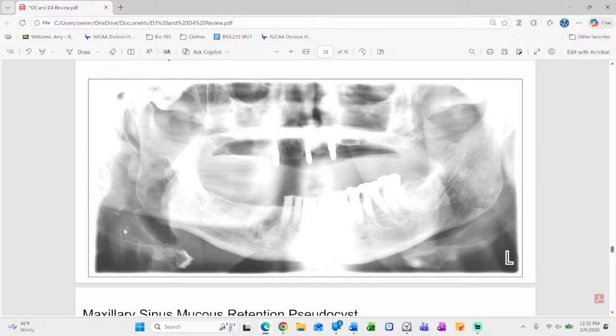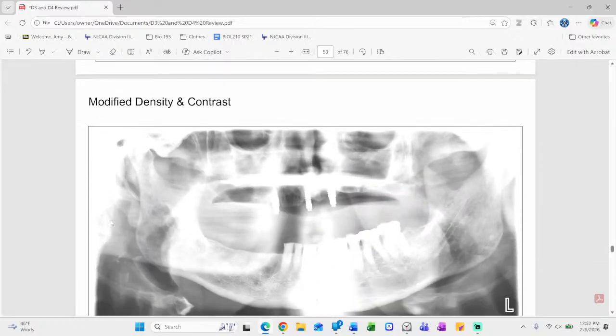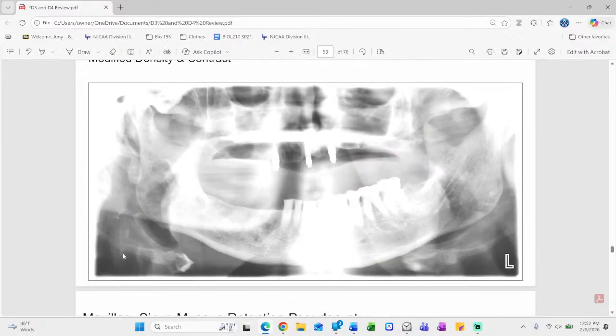This was a gentleman, and whether this is my thyroid cartilage or not, see, it's not continuous down off, but I've got a little bit of what I think is carotid plaque here. Let me jump back real quick to that image. Yeah, a little bit deceiving. I'm not quite sure if that is my thyroid cartilage or not. Typically, they are all the way down and off your image. But anatomy does crazy things sometimes. Okay.